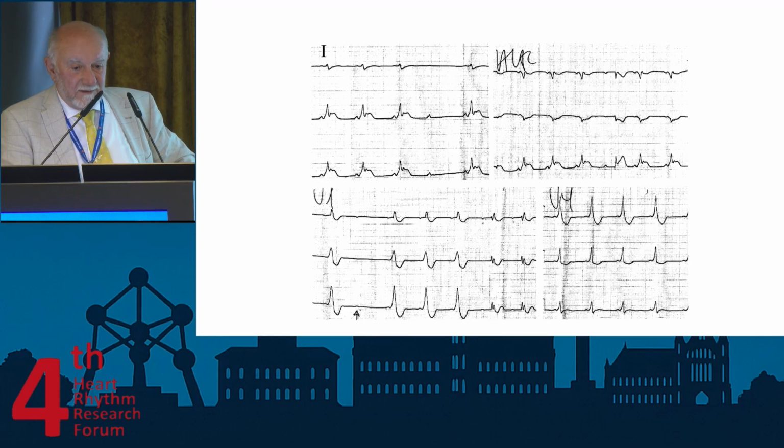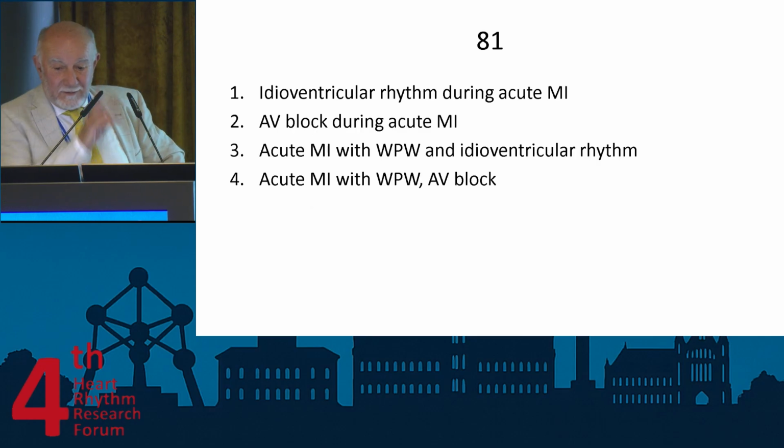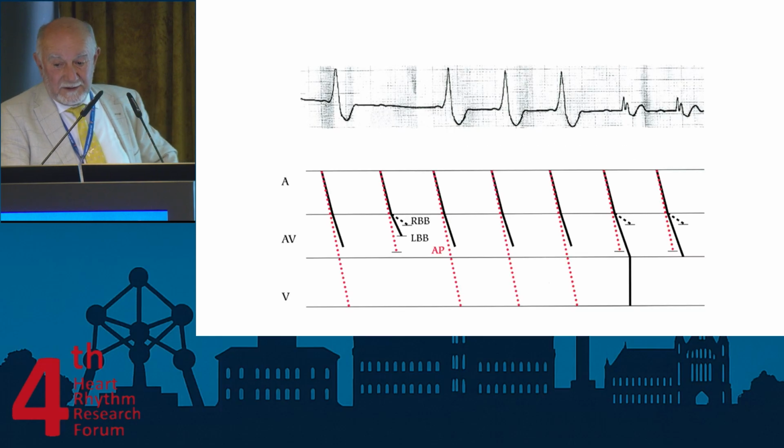Okay, that's fine. Who wants 1? Nobody? 2? AV block during MI and no more? Or acute MI with Wolff-Parkinson-White and idioventricular rhythm, or acute MI with WPW and AV block? Four. Okay, that's fine. That is what it is.